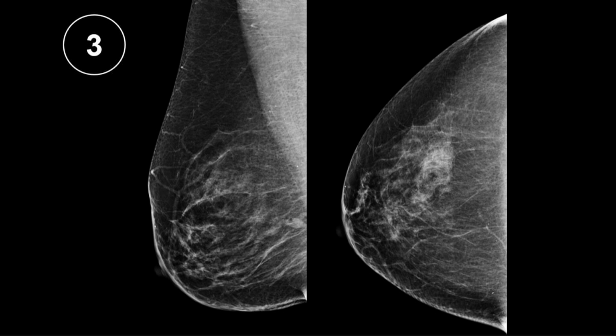Okay? There's a second finding. I would no recall that, and not the first one. Yeah, I would no recall it too, using the two-step procedure of it's not cut off here, and also there's nothing dense enough to hide that. So I wouldn't recall it, but some would. And then you just have a higher recall rate and you wouldn't find any more cancers. But there's a second finding. Okay, the second finding is that. And these are the little ones that tend to be the cancers.